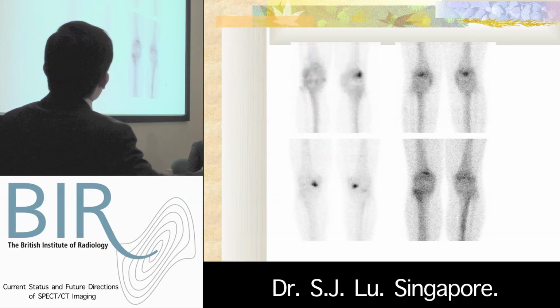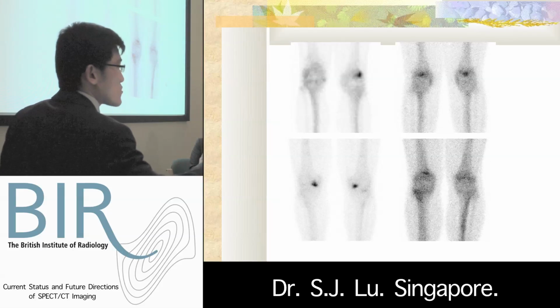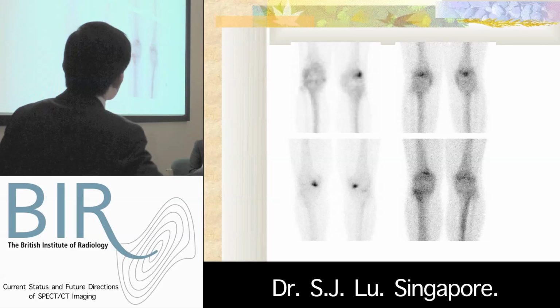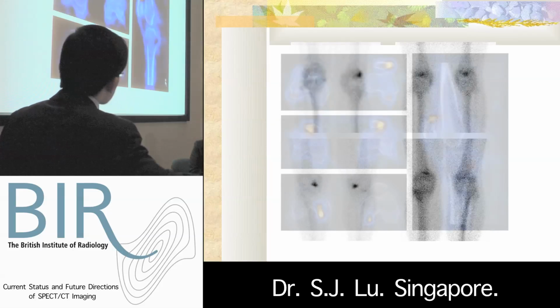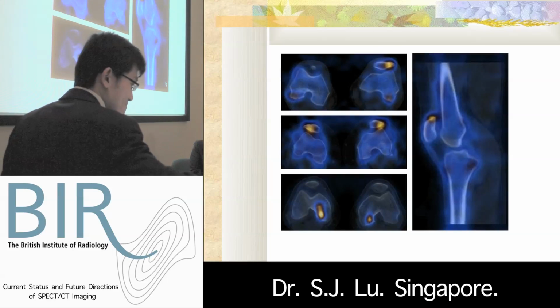And this slide puts together the bone scans of the four patients that we saw earlier on. So you can see that with just bone scan alone, it is not easy to come to a conclusive diagnosis. But with SPECT-CT, the diagnosis is clearer and more confident.